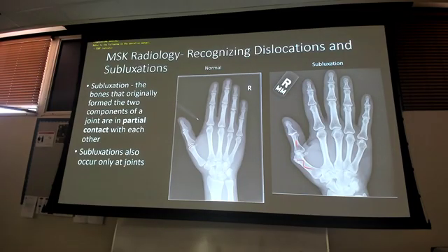So we're saying medial? When we deal with the hand and wrist, because it can get confusing, we don't use medial and lateral. We use radial or ulnar, because no matter which way my hand and wrist move, the radius and ulna go with it. It stays where it's supposed to. Medial and lateral can get confusing, so we don't like to use that. So in this case, the distal portion is shifted this way. I turn around and look, here's my ulna, here's my radius. So that is going to be an ulnar subluxation.